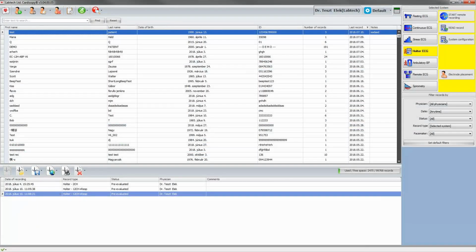So if you are using this way, you can now simply disconnect from the transfer cable, attach the patient cable, press the event button for 3 seconds, and then it will record with the dummy patient, and you can give the necessary information about the patient after you have read the recording from the Holter.